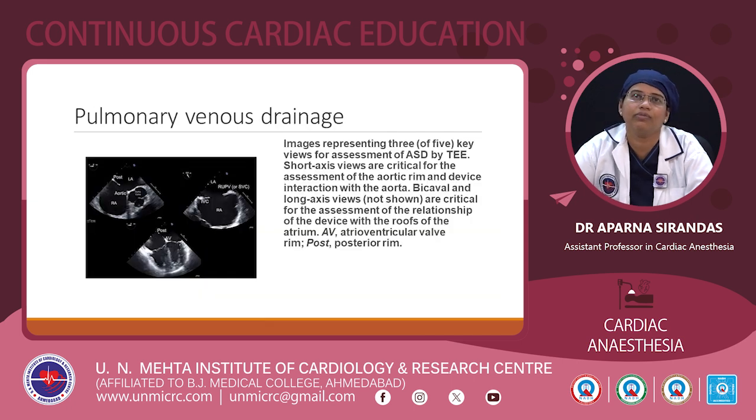Then coming to the pulmonary venous drainage, images representing 3 key views for assessment of ASD by TEE. Short axis views are critical for the assessment of the aortic rim and the device interaction with the aorta. Bicaval and the long axis views are critical for assessment of the relationship of the device with the roofs of the atrium.